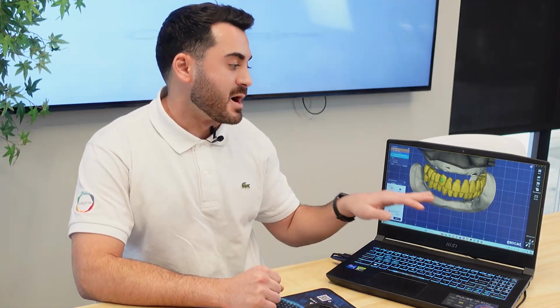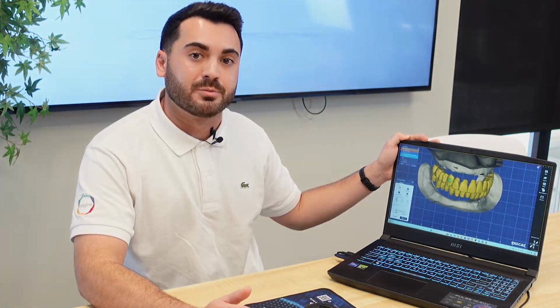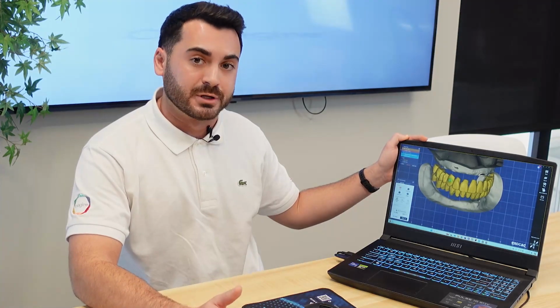Here, it's just letting us know that some teeth are intersecting. That's completely okay. After the tooth placement, we have the option to actually freeform our denture teeth. Here, we can choose to modify our teeth or occlusion if desired. It allows us to make changes such as adapting the static occlusion and proximal and also smoothing the outer surface, just like we can do in the full denture module.